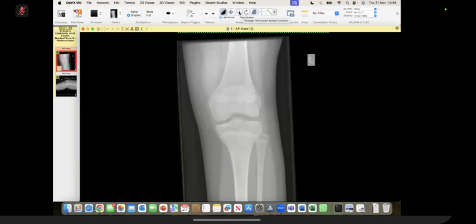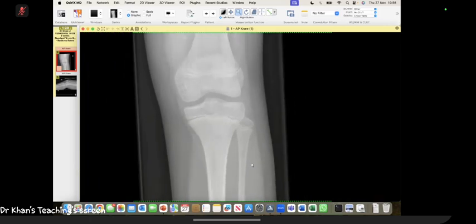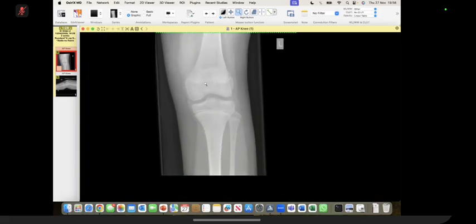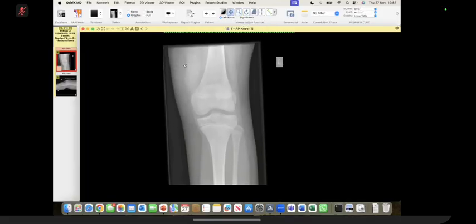I would like to know from the history of the patient if the patient has any history of fever. Is there knee swelling? Yes, sir. The knee swelling, which I noted earlier, was a soft tissue swelling on the medial aspect of the left distal femur with some calcific foci noted inside it.